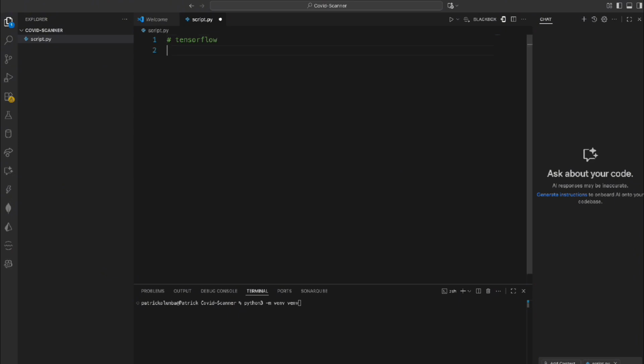We're gonna need TensorFlow, and another thing we're gonna need is Matplotlib, if we want to do a graph to show some stuff, which we're gonna do maybe later. Another thing we're gonna need is NumPy, and another one we're gonna need to install is Pandas, and then we're gonna need scikit-learn basically. So these are all the libraries.